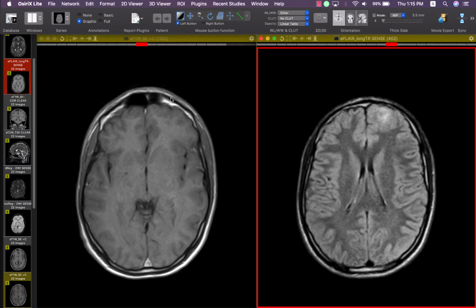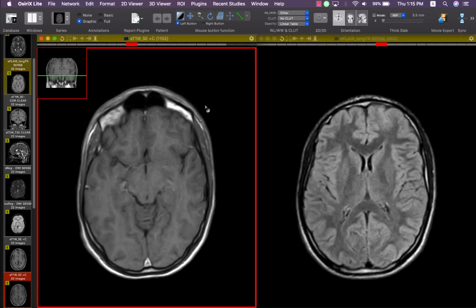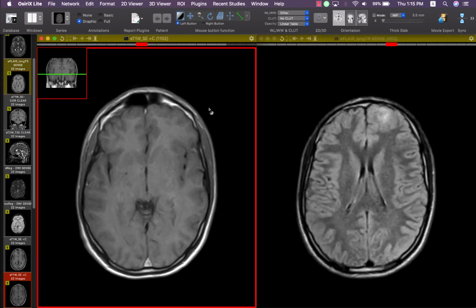As in this case, this is a 16 or 17 year old boy, so this is usually matching with focal cortical dysplasia. The last sign, which is not present here, is the transmantle sign, which is a band that extends from the lesion to the ventricular system. If you see this, it is pathognomonic for focal cortical dysplasia.